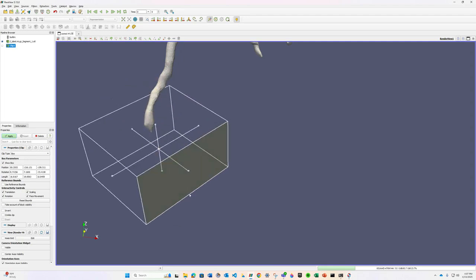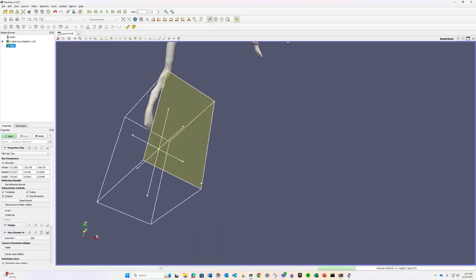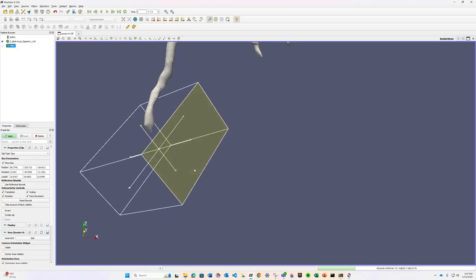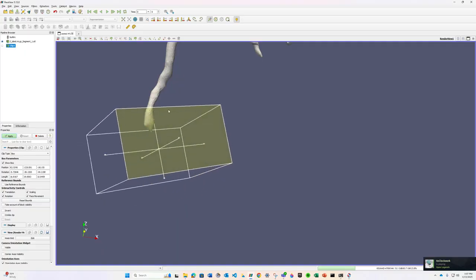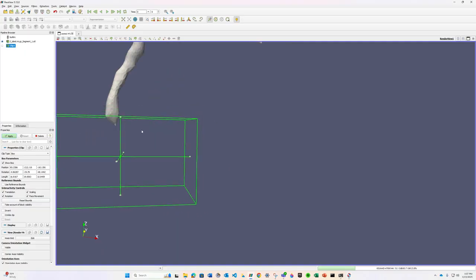So how you do it is you rotate clockwise and then anti-clockwise to really get it to where you want it to be. If this is down here and you want to move it up in this direction, you have to rotate clockwise while you're going up, and then anti-clockwise to get it to where you actually want it to be.